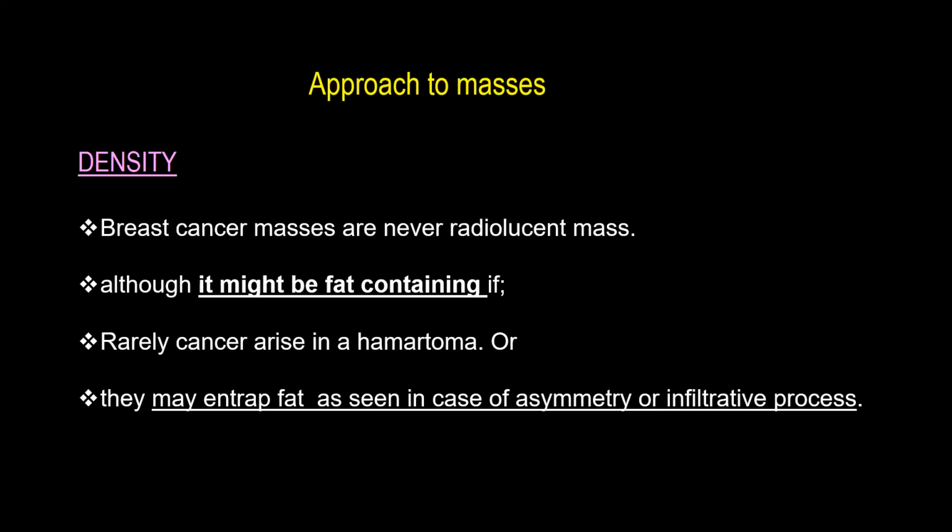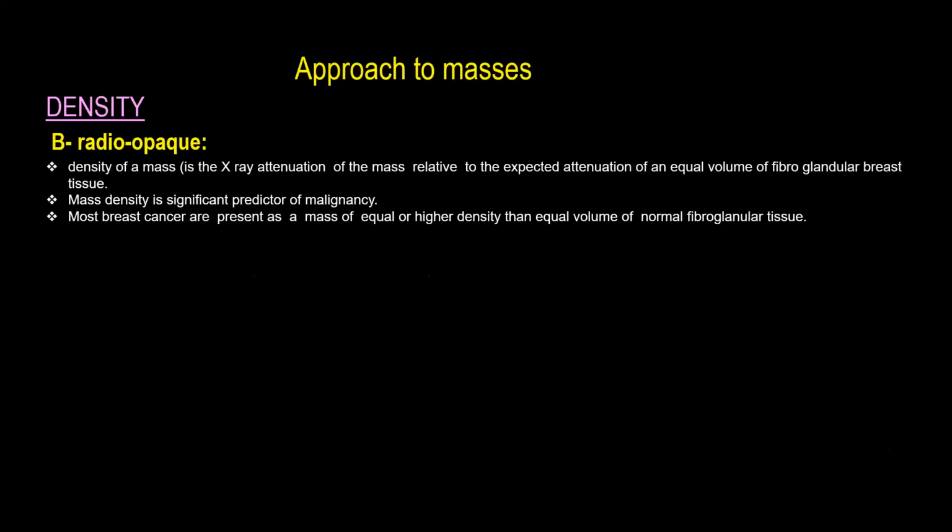Not a real mass, but in a case of asymmetry or infiltrative process, it might entrap fat within. So cancer can contain central areas of fat or lucency, but not in a case of a homogeneous mass.